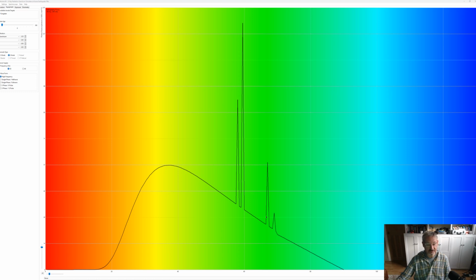So K are the ones which have got the most energy, and so they're the highest energy spikes. And adding filtration is not really going to alter those specifically or remove them. We can add some extra filtration here. I'll show you. If we add some copper filtration, for example, let me just expose this so that we've got it fixed.